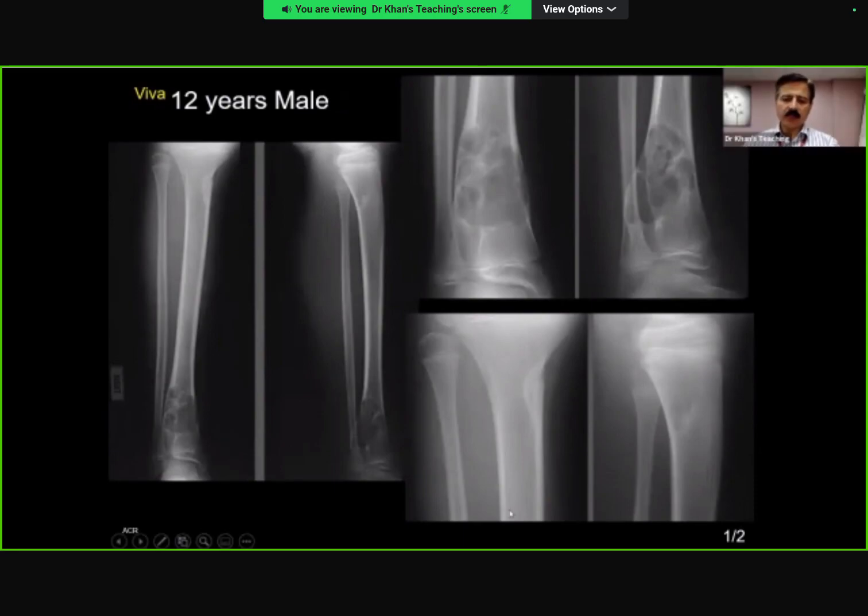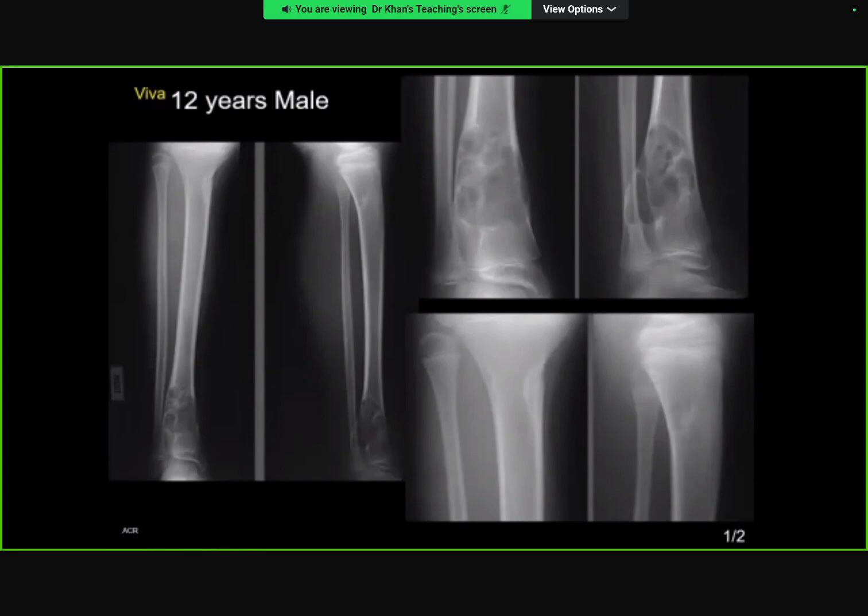Excellent. And what is happening here? So in the proximal tibia and the proximal metaphysis, I can see another lucent lesion with a sclerotic margin, and again, no surrounding periosteal reaction, no cortical breach. So it has a narrow zone of transition, again a benign lesion, and my differential for this would include a fibrous cortical defect. It's quite eccentric.